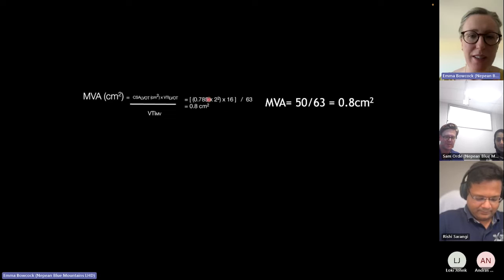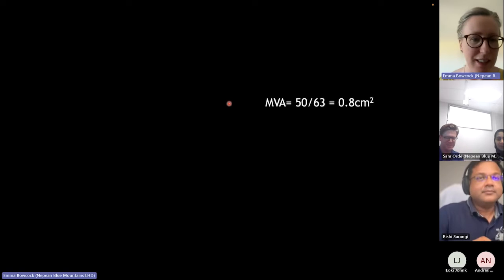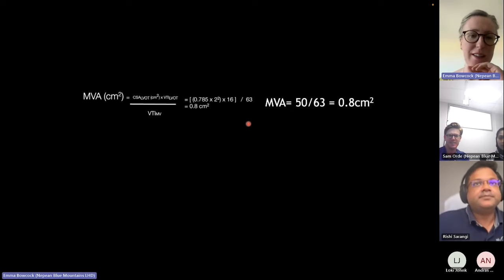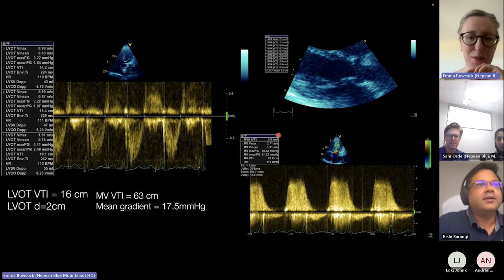Anyway, it ends up being cross-sectional area, pi r squared, times 16, the LVOT VTI. Did I give you the right one? Yeah. Double check my maths. That comes to 50 over 63. That gives us 0.8. Yeah, and it actually has it there as well for anyone who wants to cheat.